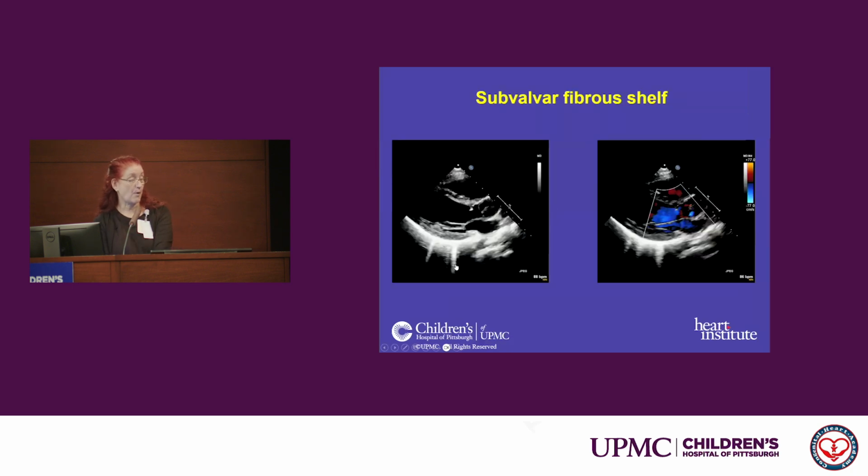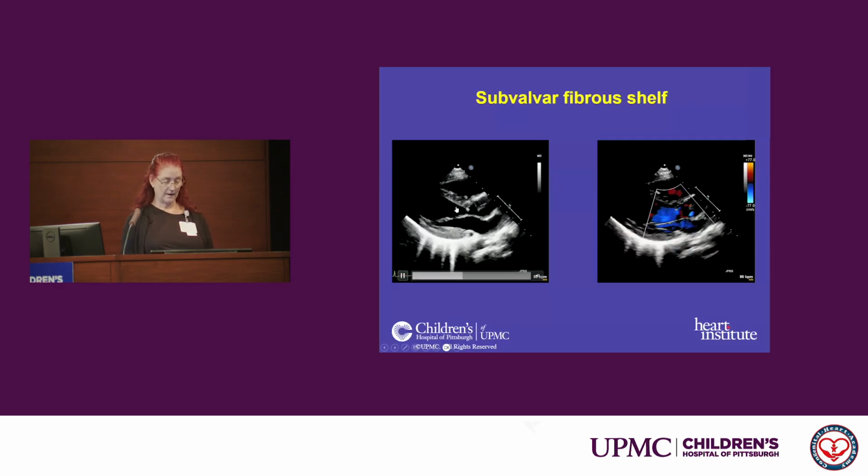So moving on to other parts of the left ventricular outflow tract and how they interact. Subaortic membranes are fairly common, so we can see it arising from this muscular septum. And things that I notice when I look at this, you certainly see that membrane, which remember is really going to be a 3D surface. I sort of think of it as like a crescent-shaped or a crescent moon going all the way, potentially all the way around the LVOT. But if you look at this anterior leaflet, you can see that it's fluttering. It's being hit by an abnormal jet, and this is probably part of the reason you can develop AI.